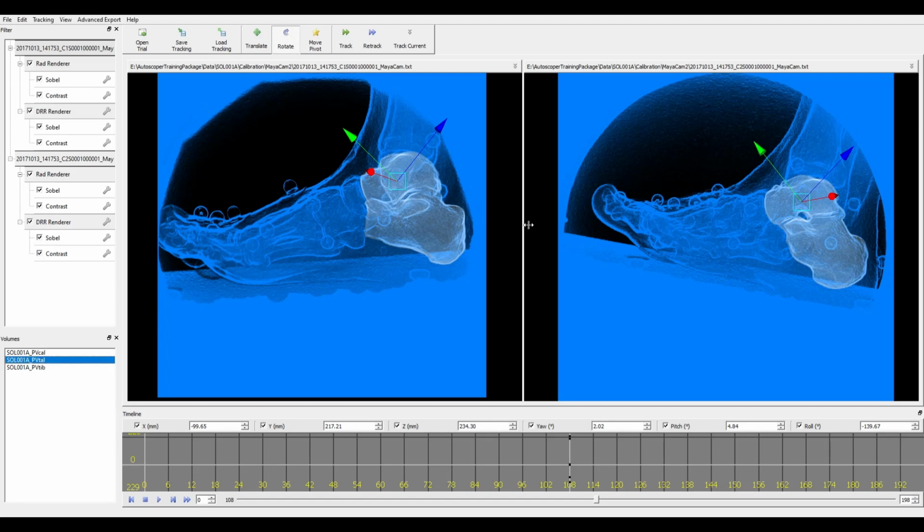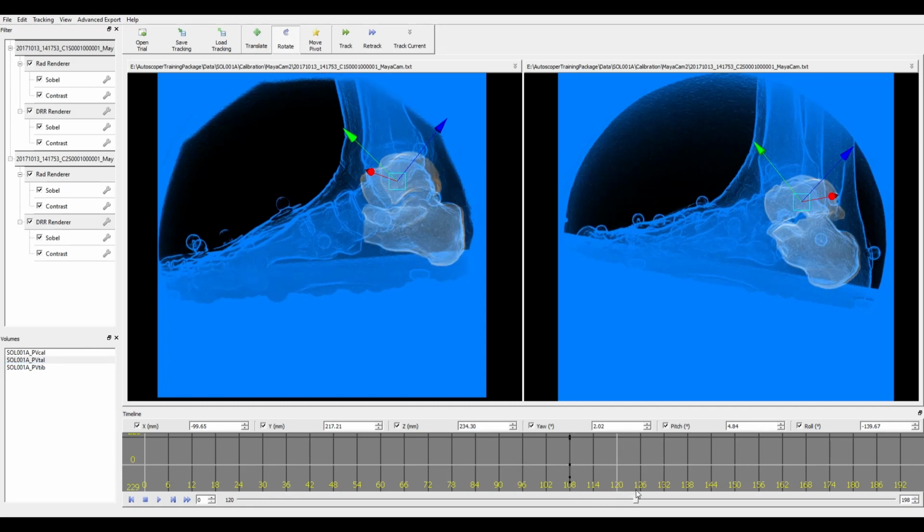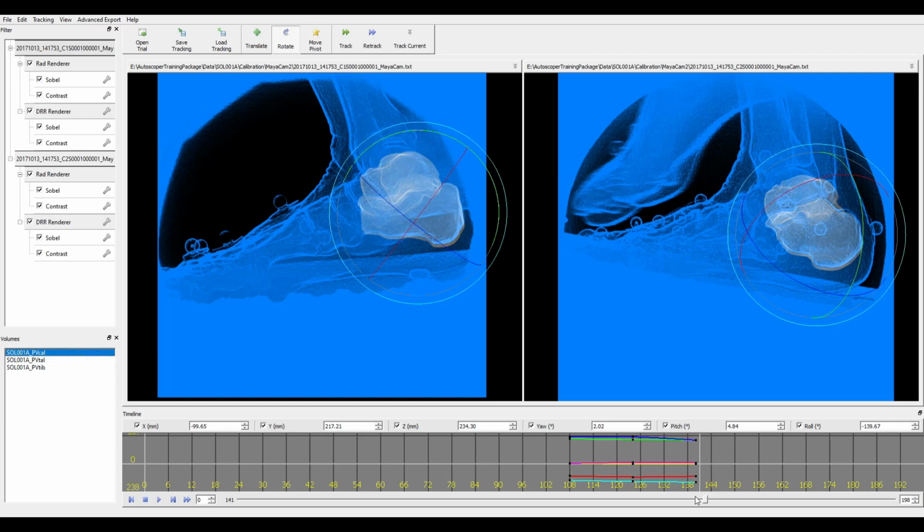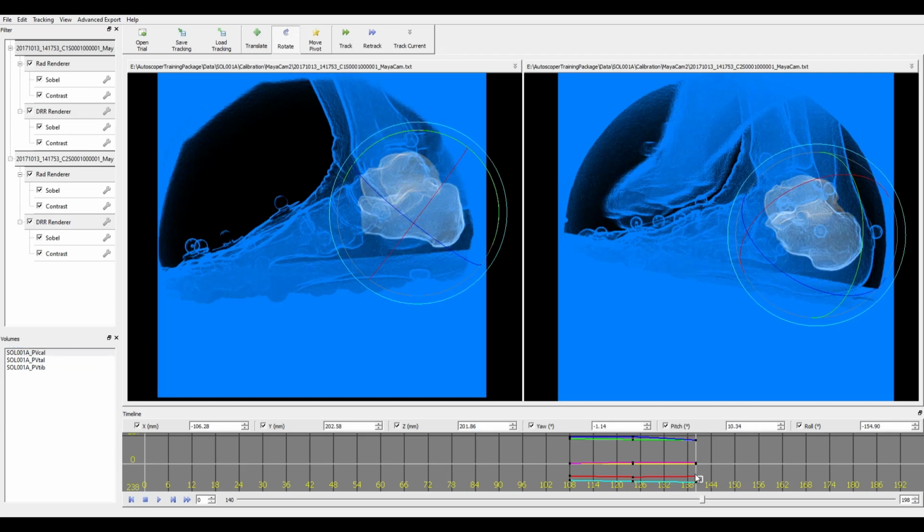So that's done there. The lines are pretty good. I'll hide it. Verify that everything's in line. All the anatomical features. So it's looking pretty good. I'll do the same for the other frames. So we did frame 140. So I'll copy that from the Calcaneus as well.